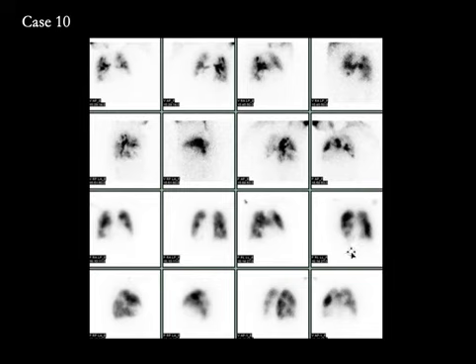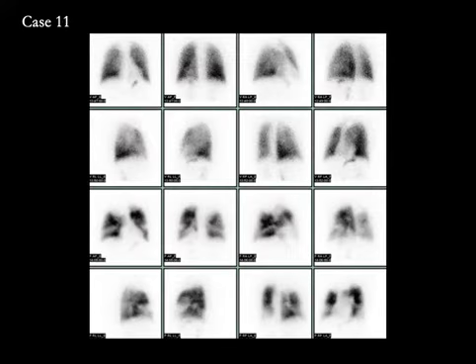RPO, LPO, RPO ventilation compared to perfusion. Perfusion is much better. And here LPO perfusion compared to ventilation. Perfusion is slightly better. So a low probability scan for PE and likely severe COPD. We also see central deposition from turbulence.